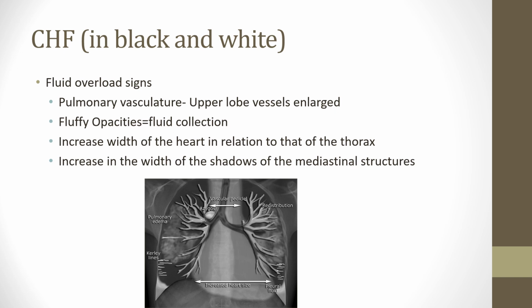All right, congestive heart failure. Kerley A and B lines, something we covered back in disease class, but fluid overload signs, big things you want to look at here. A, heart size. Pulmonary vasculature is going to show a lot of fluffy fluid collection. They're going to say vascular filling with these, and it's usually going to look like a large cardiothoracic ratio, which is going to be one of your big signs that this could be a fluid overload or CHF.